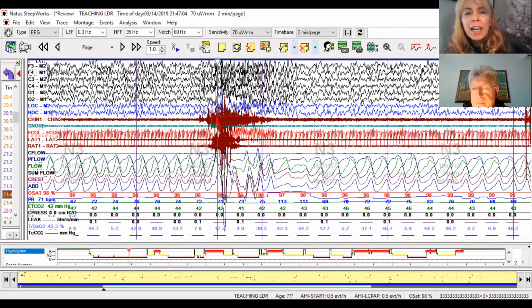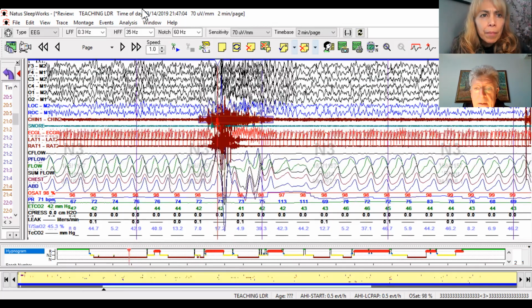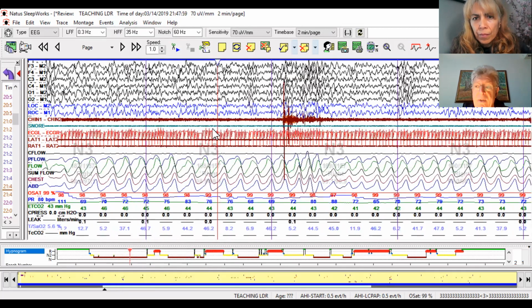So in this particular case, you would put the arousal and then you put yes, also the movement, because they overlap, no? Yeah, exactly. And then we would continue the movement here. And it will depend on the PSG reporting system to associate the large muscle movement with the arousal. It depends on the programs, whether they allow you to define your associations.